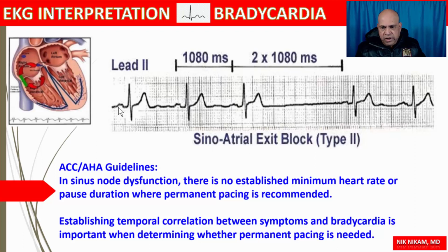Here we have an atrial activation followed by a QRS activation. Here's the same thing, and here we have the same thing. Now when the next atrial impulse is supposed to come somewhere around here, we don't see the sinus impulse or the atrial activation. There is resumption of the sinus rhythm.